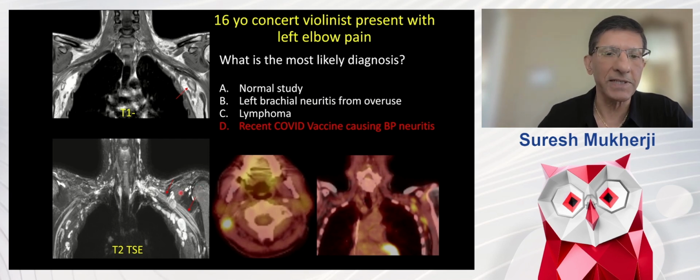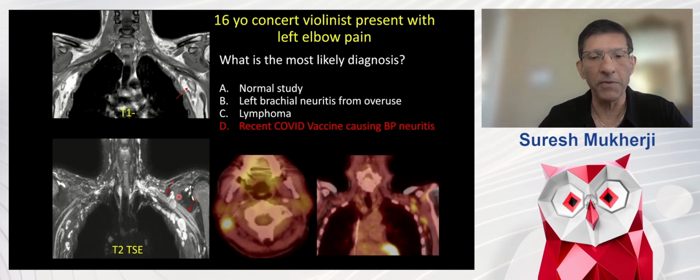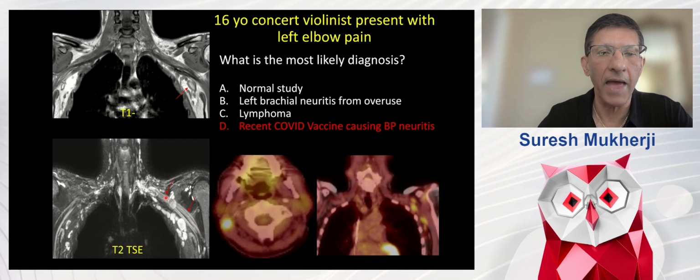And the next brachial plexus study I had was her sister. So they both had COVID vaccines, they both had enlarged lymph nodes, and they both had asymmetrical signal involving the STIR sequence. And finally, just to emphasize this fact, this was a patient that had melanoma. We knew that this was metastases because this was biopsied. But when we looked at the PET CT, we saw all of these enlarged lymph nodes, and the patient had a left-sided brachial plexopathy. Now, was this actually metastases or was it something else?